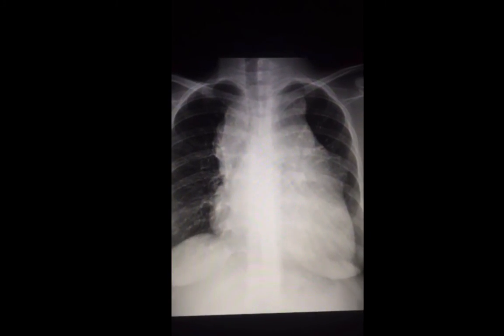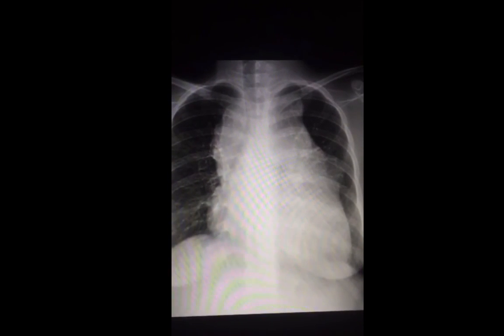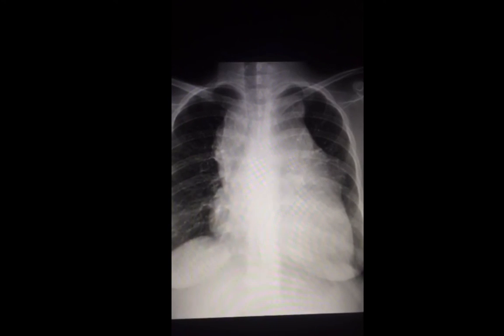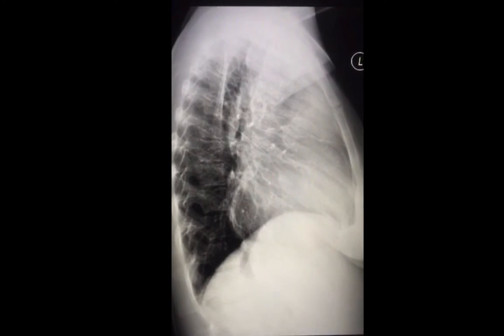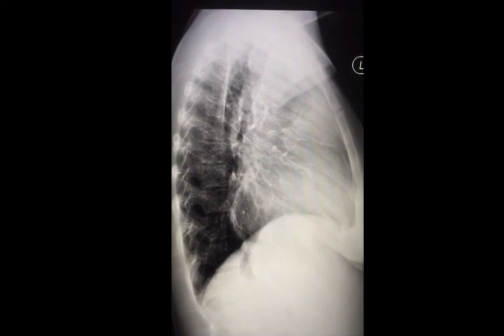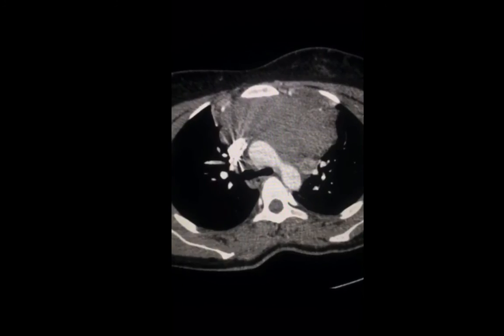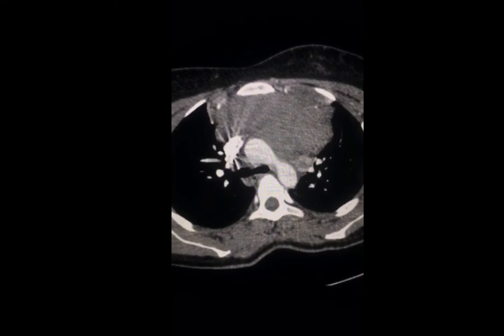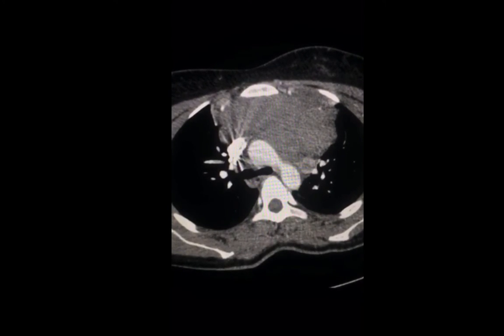So this was a nice case to talk about an approach to differentiate anterior, middle, and posterior mediastinal abnormalities from chest radiographs. We also showed an example in which the lateral is not as scary as we think. It's actually useful, so always look at the retrosternal space and it should be clear. We finally talked about the differential diagnosis of an anterior mediastinal lesion, remembered classically by the 4 T's.